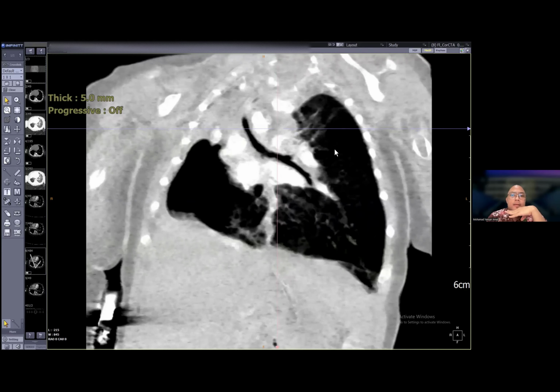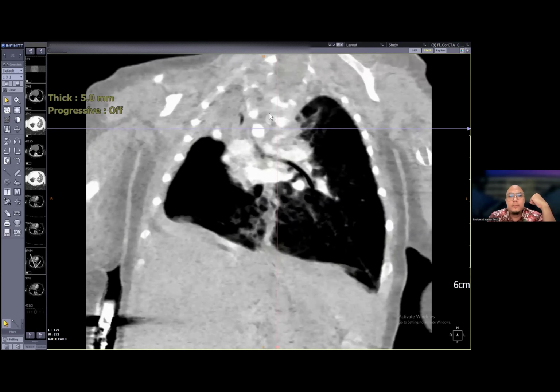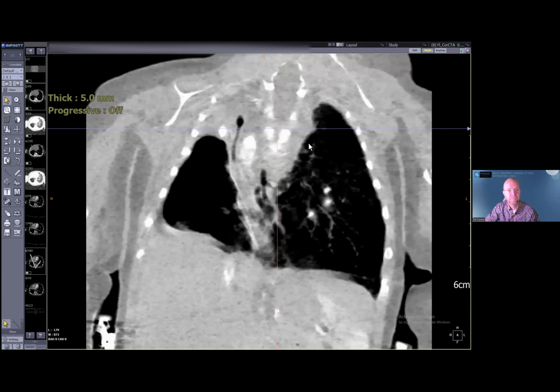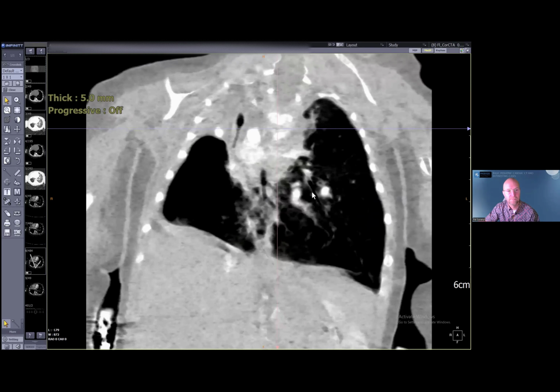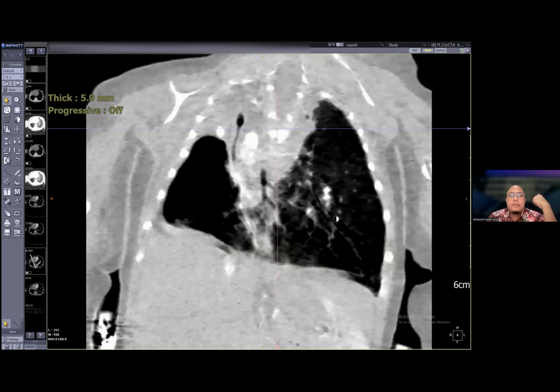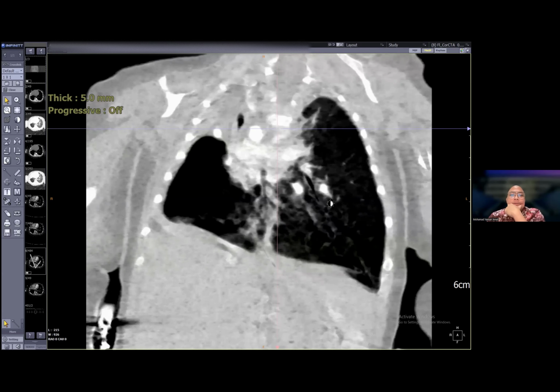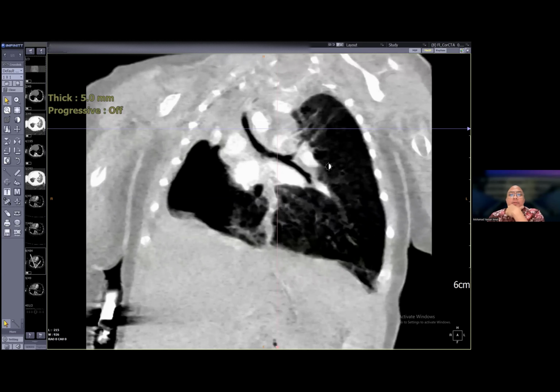The bronchus that goes to the inferior lobe is not directly from the carina, but from a branch of the left bronchus, proximal of the left bronchus. Yeah, here you can see my arrow. Oh my goodness, that is crazy. Yeah, this patient is really difficult for a surgeon.